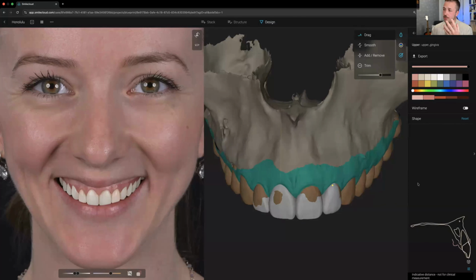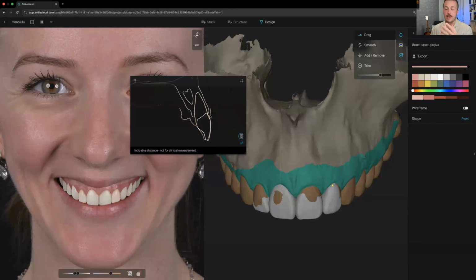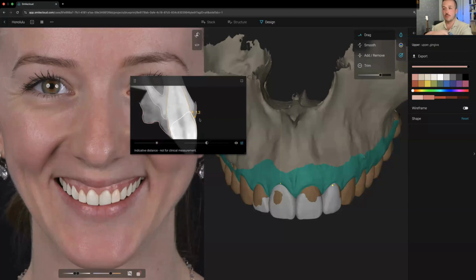So not to go too much into details, because we covered this a lot in the program on how to do crown lengthening, what are the decisions to make, how to analyze the positioning of the bone. Should we go flapless or should we go full flap? So if you see here, when we move this tissue, we're gonna get closer to the marginal bone. So that means we have to correct the bone level to a new point, which would actually allow us to have new biological width.